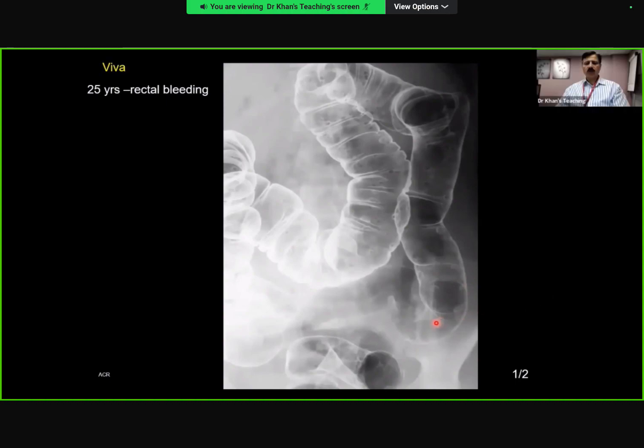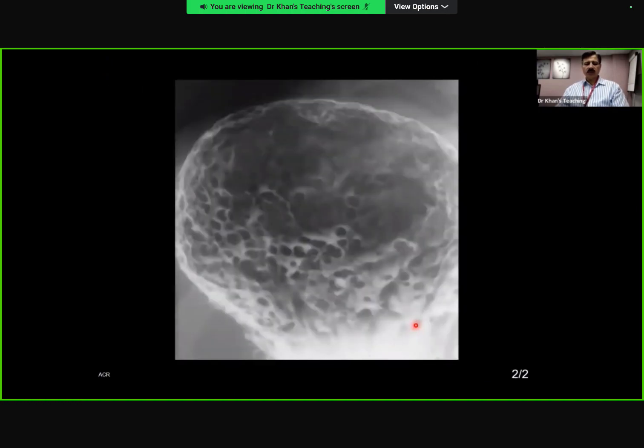Right. So the point is that there is the same patient. What is this, and where is it? So that's in the stomach. Multiple filling defects along with surrounding contrast. So that is the fundus of the stomach and multiple polyps. So I'm concerned about hamartomatous polyposis or varices. Excuse me, this is the same patient as the previous one.